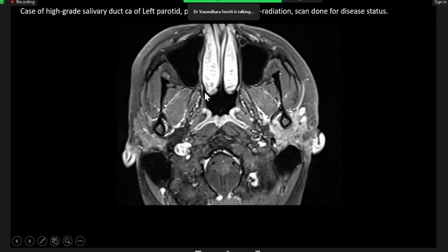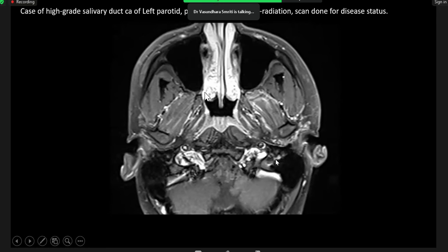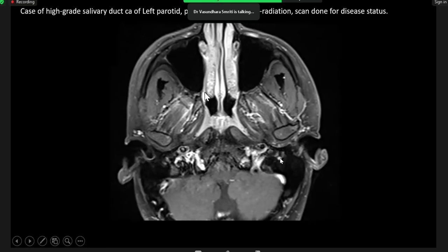So as this was traveling medial to the mastoid tip, you see the stylomastoid foramen. Now it was entering into the mastoid groove. As you go on, this is the stylomastoid foramen. There was enhancement present over here. Further up, you see an enhancing structure over here. This is the perineural spread along the facial nerve.